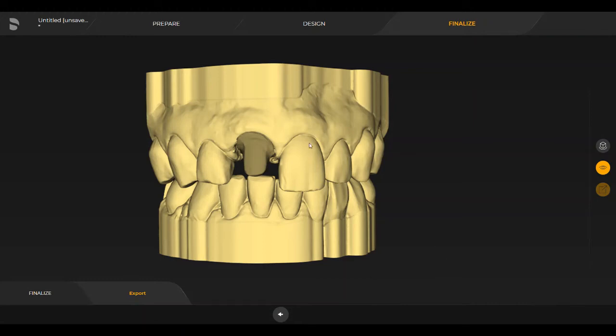What that's going to do is export a buccal bite image of the top and the bottom teeth fixed together as a single file. That's going to allow them to import an adequate buccal bite registration. So for that, you're going to go ahead and click STL. We're going to save this to desktop as buccal bite and click Save.